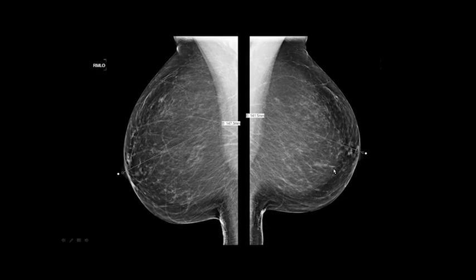Here's the MLO view. So measure from where the nipple attaches to the breast to the muscle. Same thing here. And you can see it's 14.1 and 14.7. So on the right breast, 13.2, 14.7, that fails. That fails the measurement, and they will mark you off on the paper for that.